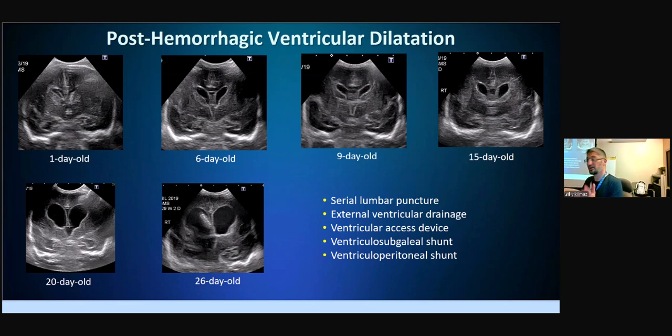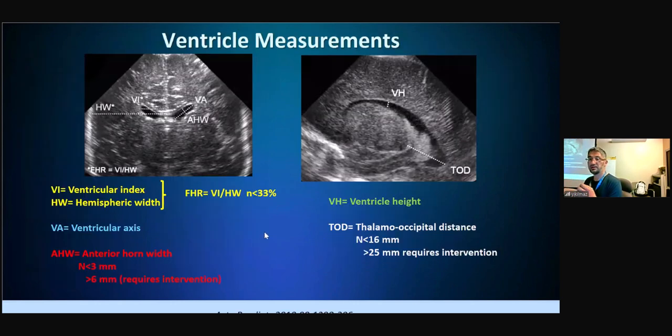Based on some factors, but primarily based on ultrasound and primarily based on our measurements. So these measurements are of the top priority when doing an ultrasound. If there's a germinal matrix hemorrhage, it's not really important to grade the hemorrhage. Most likely you won't be accurate unless you do an MRI, but it is important to measure them nicely so that the surgeons will decide if they should insert a VP shunt or not.